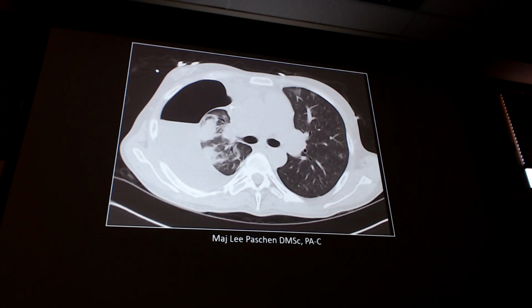All right, what do we got here? First of all, what type of study is it? CT, what slice? Axial, good job on those questions, by the way. Oh, okay, I heard pneumothorax, I like it. Or a hemothorax. Can I have both? Yes. Absolutely. Just put the words together.